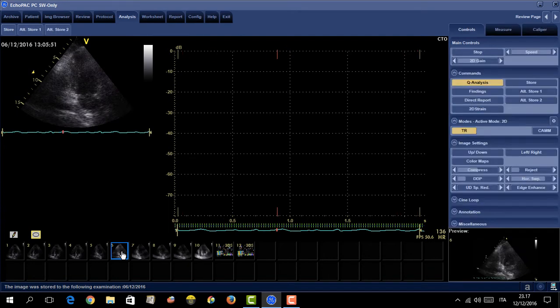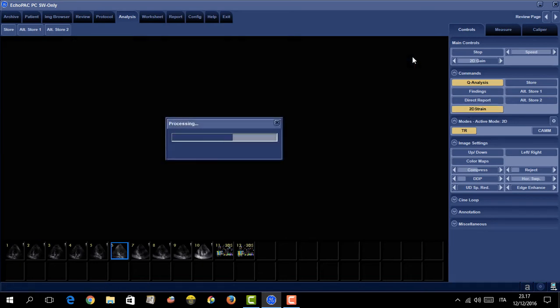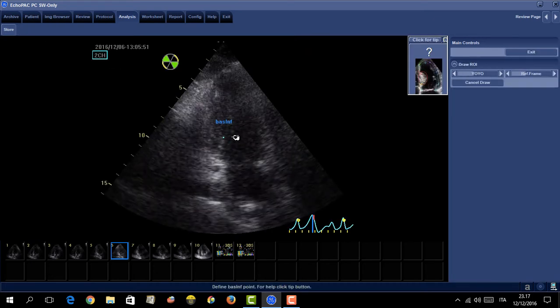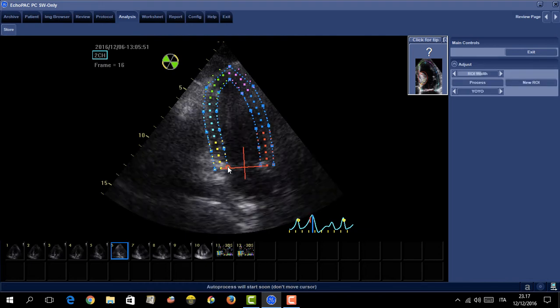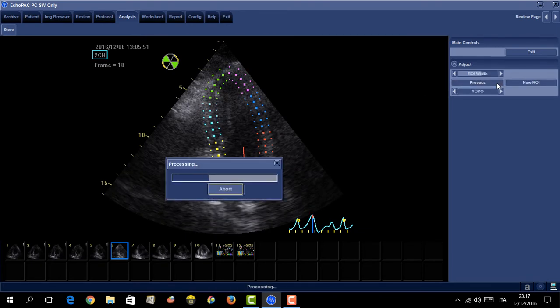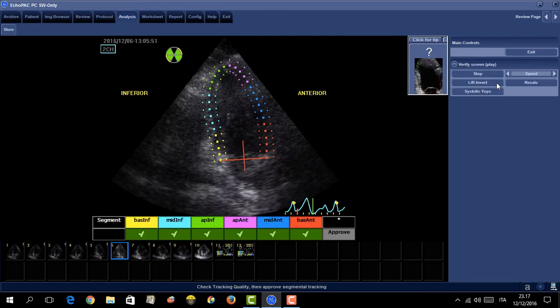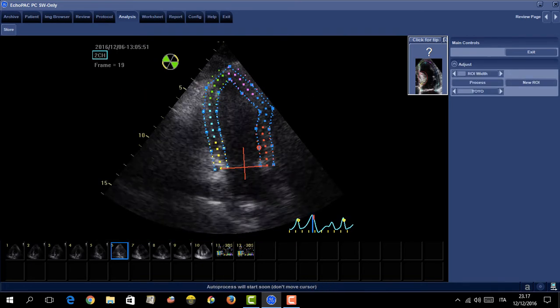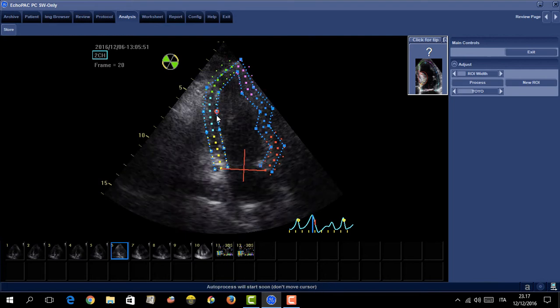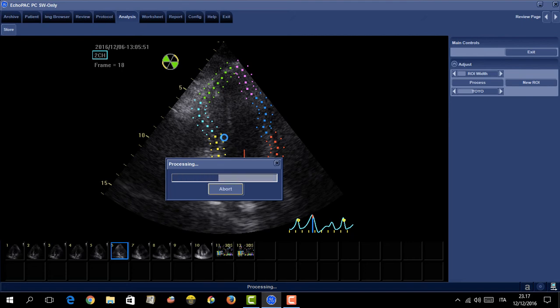As another example, I'm going to show you what happens when you actually miss completely the point when trying to track the endocardial border with the software. So let's say I will not do any corrections and let the software do whatever it wants. Okay, still here it liked it, but let's presume I don't want to be precise at all, just to show you what might happen. Hopefully the software will say it doesn't like it.